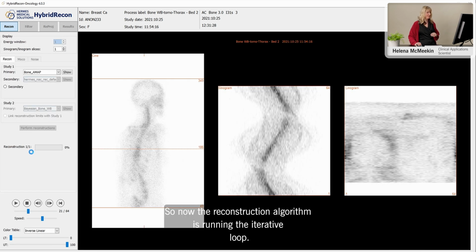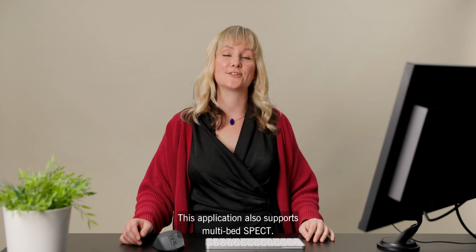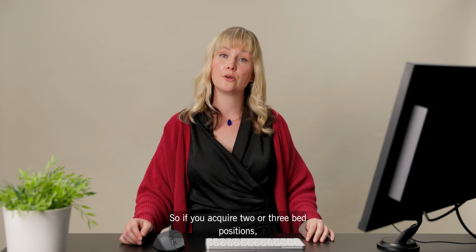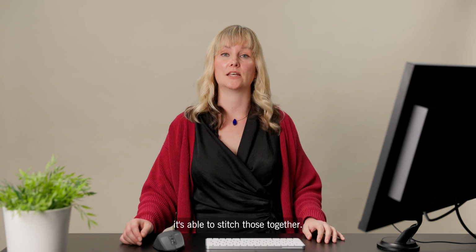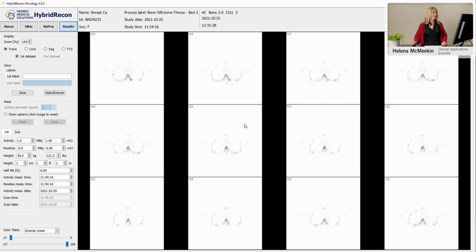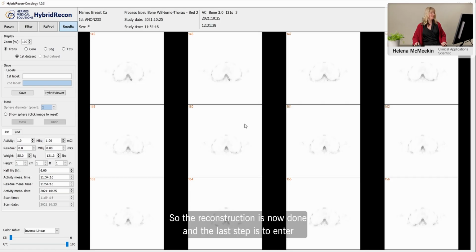Now the reconstruction algorithm is running the iterative loop. This application also supports multi-bed SPECT. So if you acquire 2 or 3 bed positions, it's able to stitch those together, and then you can use that for your reconstruction. Okay, so the reconstruction is now done.